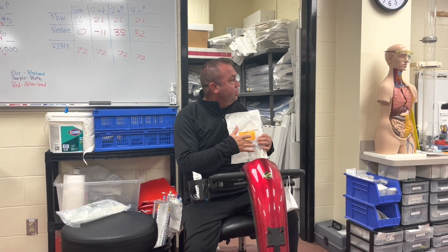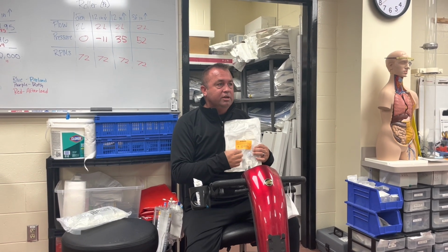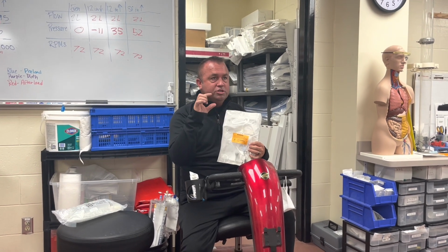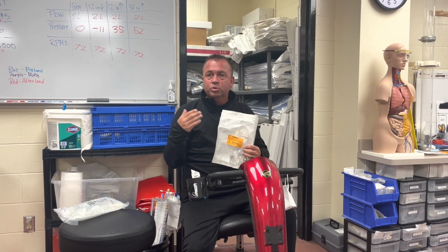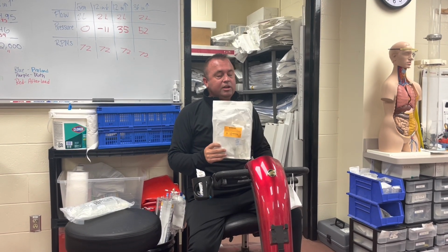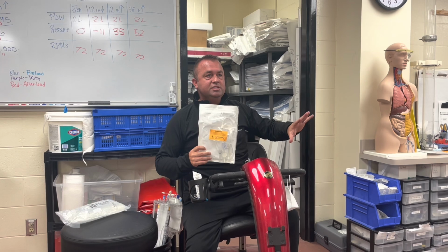So, signal, Wheatstone bridge, piezoelectric. There's a signal in here and it converts the pressures on two different sides of a membrane to an electrical signal. That's how we get a pressure number and a pressure readout. That allows us to hook it up to a monitoring system.